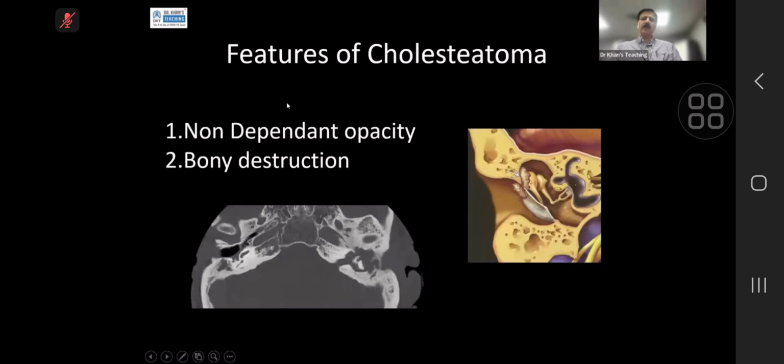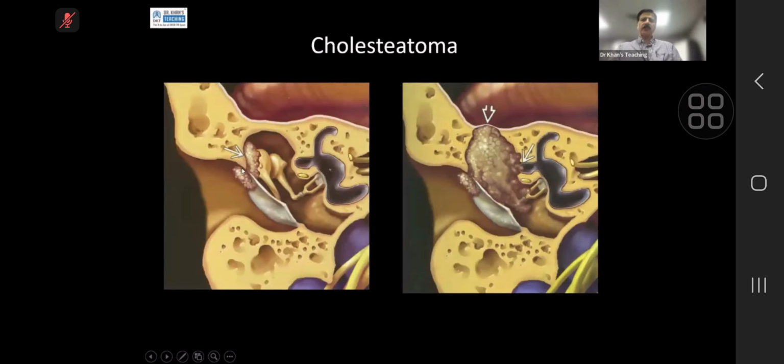So, with that background, if you see this picture here, what is happening? This is a classical cholesteatoma, which is at the Prussak space. This is a pars flaccida cholesteatoma. So, if you are an ENT specialist and you are doing otoscopy here, you will actually see an early white type of appearance. And many a times the clinicians tell us that I can see a cholesteatoma. Please see what is happening inside. Tell me the roadmap, what to do when I'm going in, what to expect. So this is a classical pars flaccida cholesteatoma.